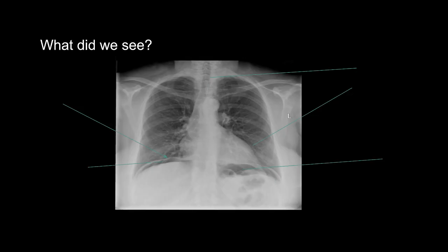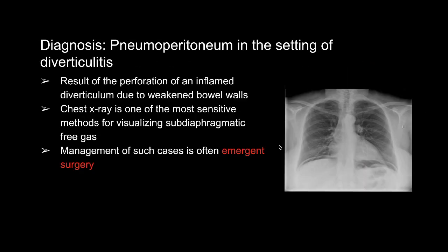So, like we mentioned in our last video, some of the basics of the chest x-rays we see here. We see the trachea here. This is our airway. You see the borders of the heart. And then getting into the problem area, you see our diaphragm here. But what's weird about the diaphragm? Well, it's all this air underneath it. Seeing that air underneath the diaphragm is usually not a good sign in imaging. So let's delve into what could be the causes of that.